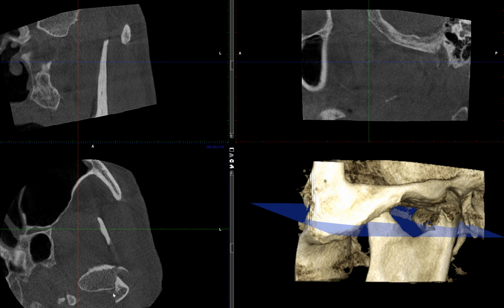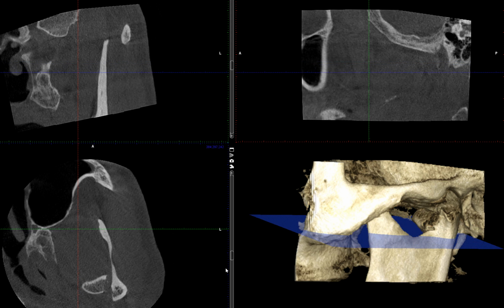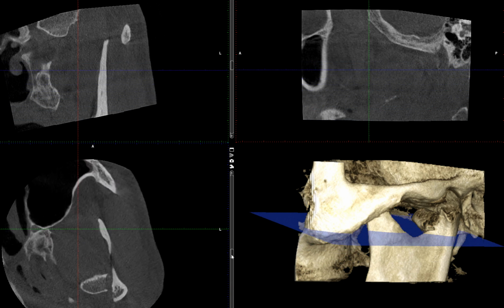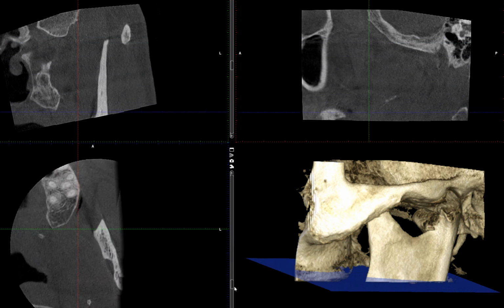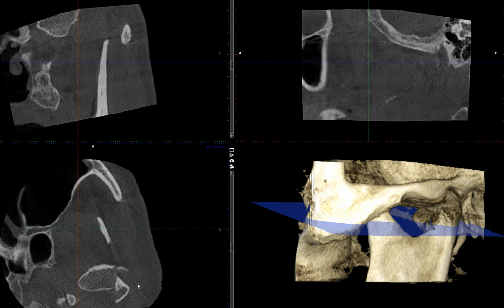Again, I know many of you haven't looked at cone beam CT, but I just want you to know this is not normal, where there's an abrupt disruption in the cortical outline. There's a definite step deformity, and also there's a separation. This will make more sense as we evaluate this in all three different planes as well as the 3D rendering view. I just want you to know that's not normal, and I'll try to make it as clear as possible.